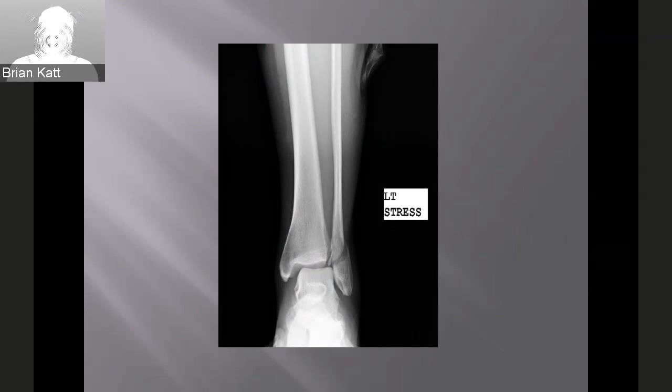So what we're looking at is widening through the joint surface here to determine if there's rupture of the deep deltoid ligament. The medial clear space is measured from the medial surface of the talus to the lateral portion of the distal tibia at the level of the talar dome. If there's more than a 4 to 6 millimeter space in there, that's indicative of the medial clear space being widened, and that's indicative of a deep deltoid injury, which creates an unstable ankle mortise.